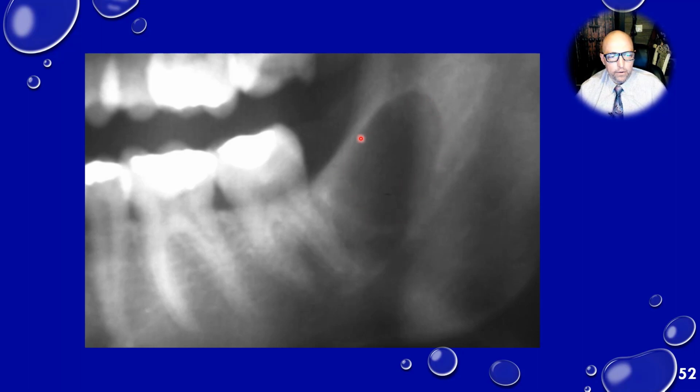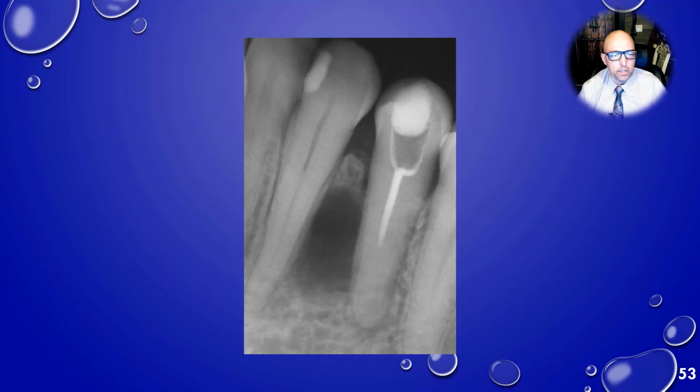And so if we ruled out residual cyst because the third molar was extracted with no remaining cyst there, what else could it be? Well, back to our DOA acronym, not dentigerous cyst because there's not an impacted tooth there. But it could be an OKC, it could be a Unicystic Ameloblastoma. This patient being 23, maybe not too old for a Unicystic Ameloblastoma, but just the right age for an OKC. It's not large enough to really tell the expansion pattern to help us differentiate those two, but this one is an OKC. So again, just our DOA acronym helps us.